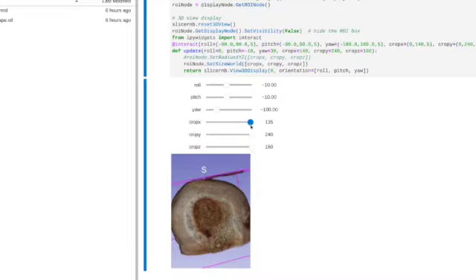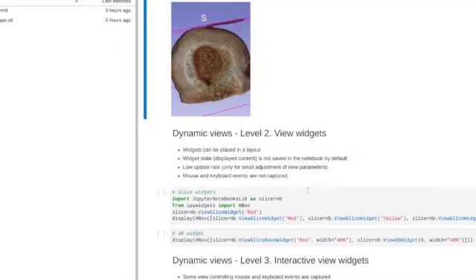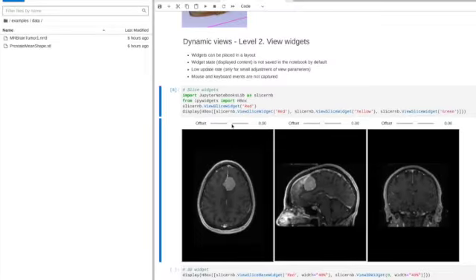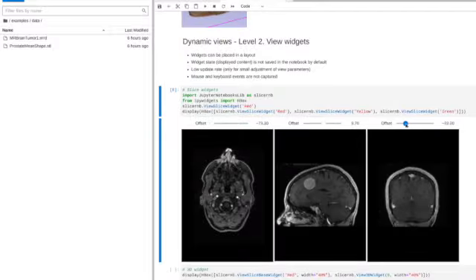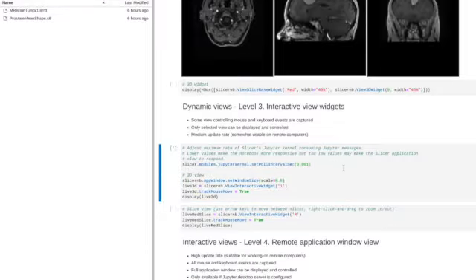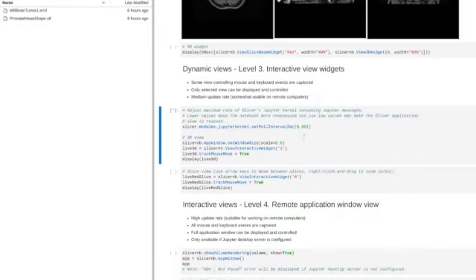This is more of the 3D visualization and exploration view. Okay, and then we have the 3 panes here. This is loading up an interactive widget that you'll be able to interact with via a mouse.